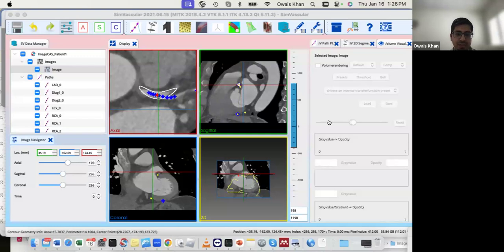So far we did left coronary artery, right coronary artery, and then we did LCX, diag 1, diag 2. You might not see diag 2 in your case. You might see diag 1. And on the right-hand side, you should do just the PDA and PLA, the two distal branches, and start with those, and then we can see how good you guys are getting, and we can start doing more smaller branches. But I think if we can all do all of these main branches, then we should be okay.